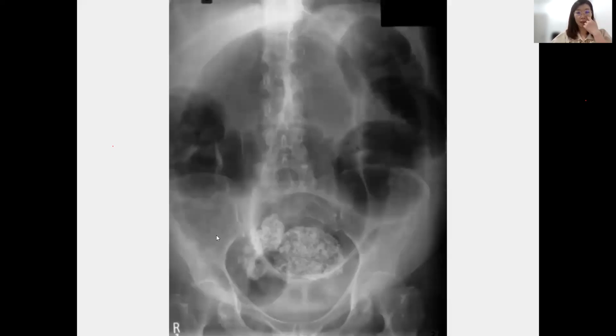Okay. So what about this specific diagnosis? It's also large bowel obstruction, right? Yes. It's also large bowel, but what is the diagnosis for this X-ray? Toxic megacolon. Okay, maybe, but not. This is specific. Once you see this appearance, only one diagnosis. No differential.